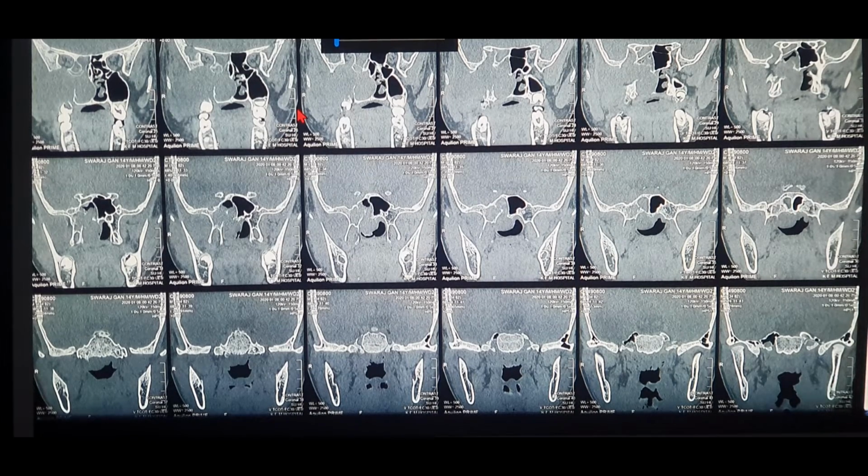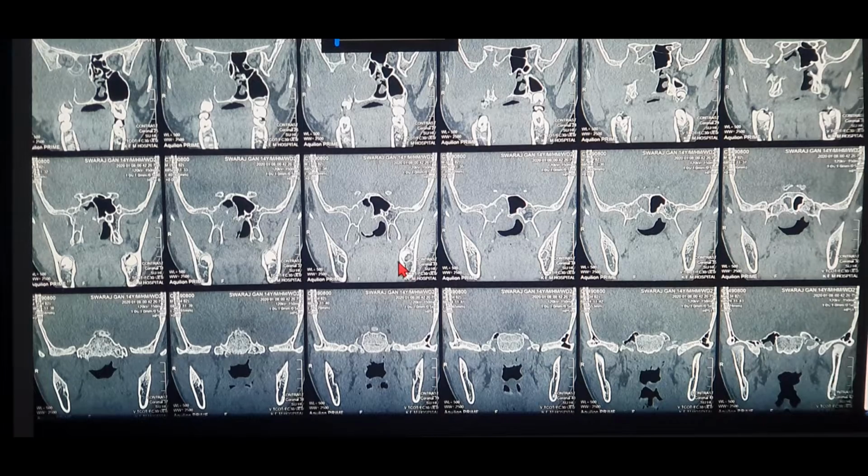that the pterygopalatine fossa is a crossroad. So it is a small area, but it is a huge crossroad. So the origin is the superior lip of the sphenopalatine foramen. So from that area, the JNA may enter medially into the nasal cavity, like here it is doing. It's entering medially in the nasal cavity. That's the first thing. It may go from the nasal cavity posteriorly into the choana. From the choana, it may erode the roof of the choana, may enter into the sphenoid. Okay, so that is how it goes.